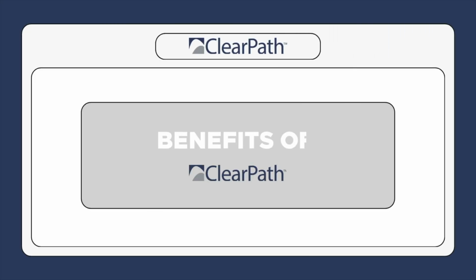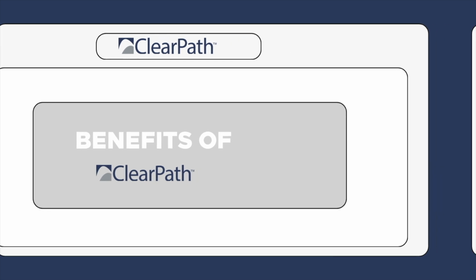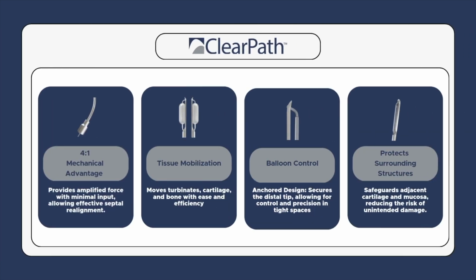Now, we will look at some of the advantages of the ClearPath Nasal Balloon system. More benefits can be found at clearpathnasal.com. The ClearPath Nasal Balloon is designed for efficiency, patient safety, and comfort. With a 4-to-1 mechanical advantage, it amplifies force with minimal input, making septal realignment more effective and controlled.